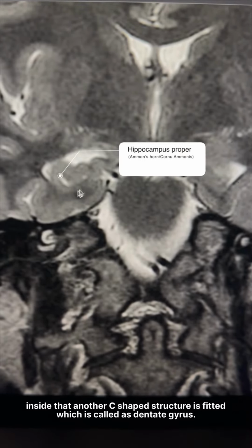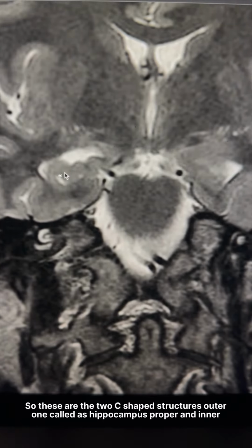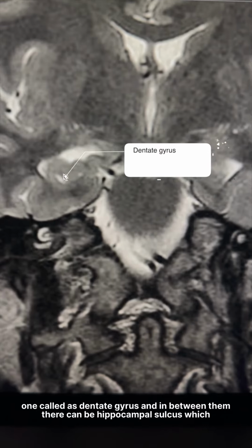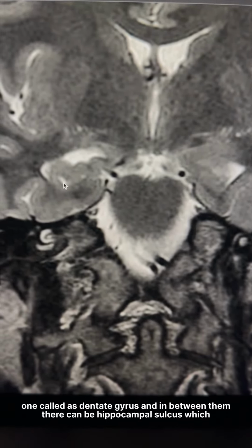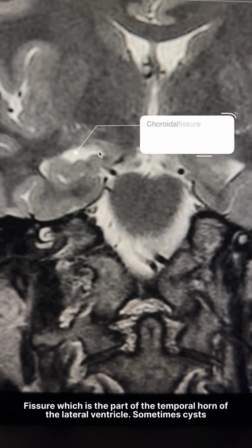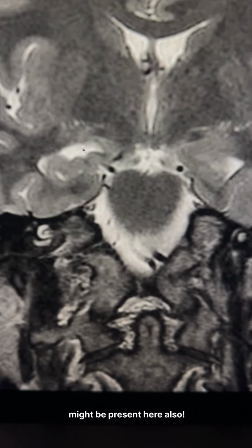Inside that another C-shaped structure is fitted, which is called the dentate gyrus. So these are the two C-shaped structures, the outer one called the hippocampus proper and the inner one called the dentate gyrus, and in between them there can be a hippocampal sulcus which usually obliterates, but sometimes there may be a cyst there. And this is the choroidal fissure, which is a part of the temporal horn of the lateral ventricle. Sometimes a cyst might be present here also.